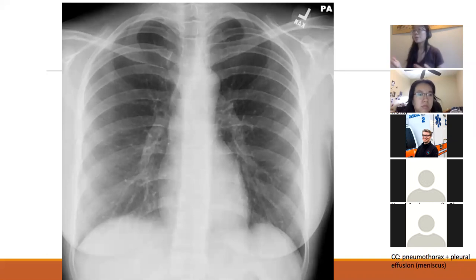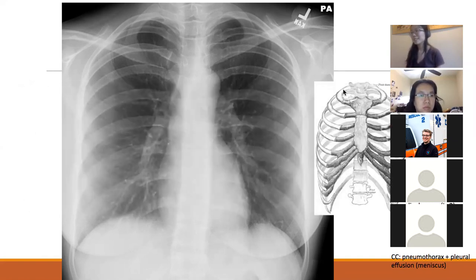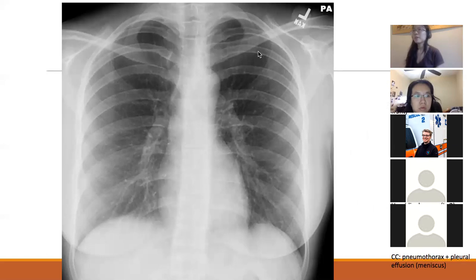So how do you know which portion of the ribs is anterior and which one's posterior? Well, I have a little bit of a hint. Okay, so the more curved ribs that you see here, that's these guys, those are going to be anterior, and the posterior ribs are going to be the straight ones. Okay, let's move on to our next bone.